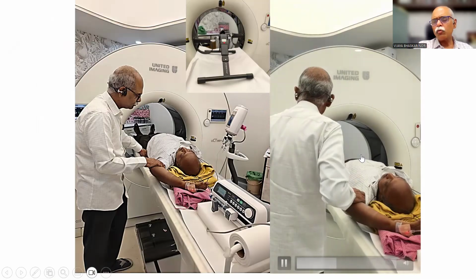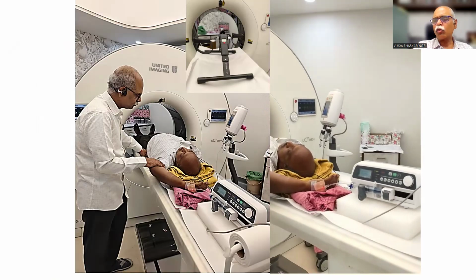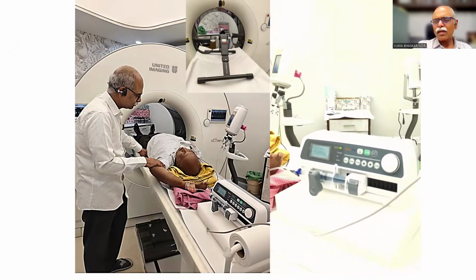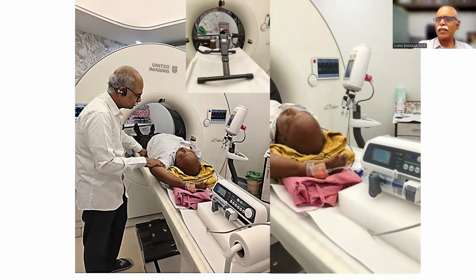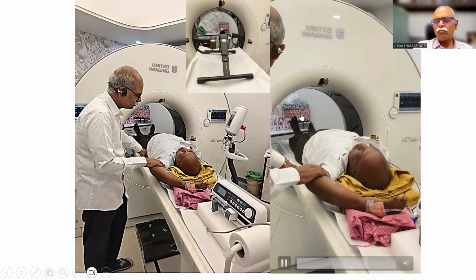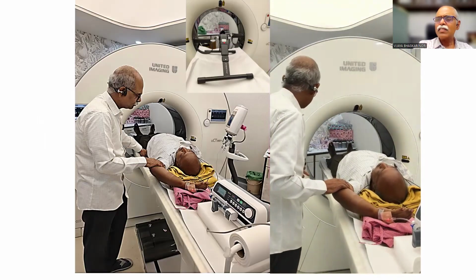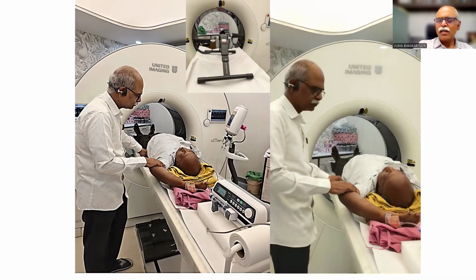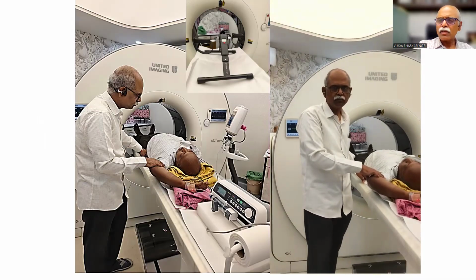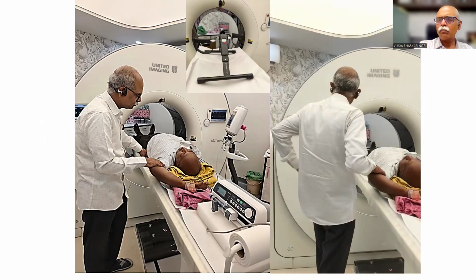And one important point, what I have learned from my senior colleague, Dr. Kumareshan, is that whenever you do a perfusion, number one, ask the patient to do some exercise. The exercise I ask is limb elevation. Within the 3 minutes, ask him to do the limb elevation, alternately each limb. This has two effects. One, the peripheral vasodilatation and pooling of blood will be reduced, and the cardiac output, the blood coming to the heart, will be improved.